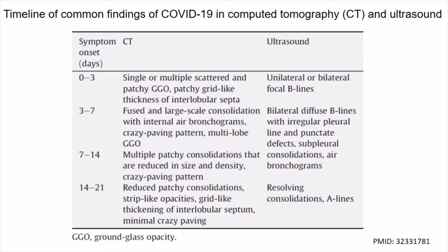A study reporting the ultrasonographic manifestations of patients with COVID-19 found that the most common findings are B lines, patchy consolidations, and unsmooth pleural lines. It has been reported that focal B lines are the major ultrasonographic feature of early-stage COVID-19 pneumonia. Since these findings are also present in other viral pneumonia, lung ultrasonography is not specific for the initial diagnosis of COVID-19.